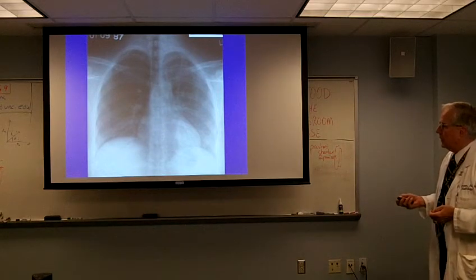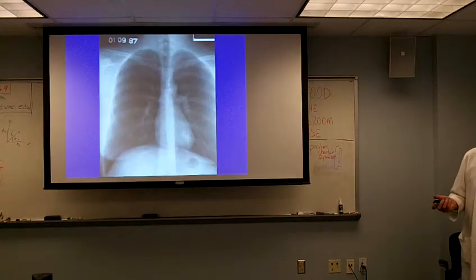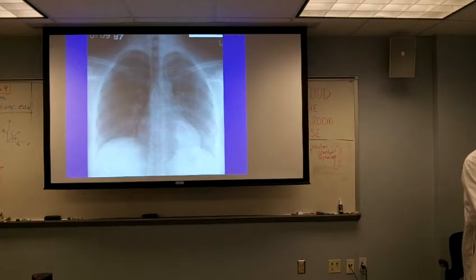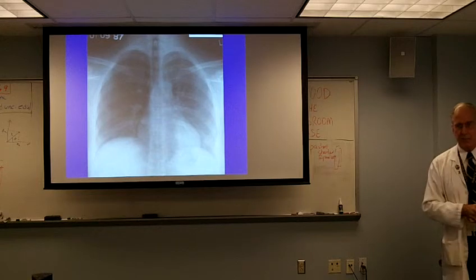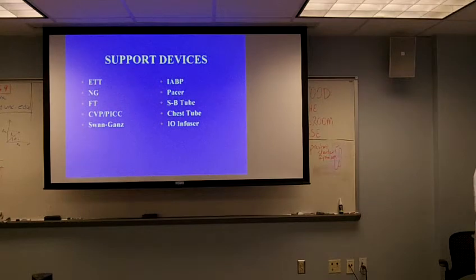Here is a patient; this was an upright film, but it's done in full expiration. Contrast that to this appearance. This is the same patient, two minutes apart, in full inspiration. Look at the difference in the appearance of the heart on the two exams. It looks vastly different. You also notice that down here at the lung bases, the vascular markings are not quite as crisp, and that's what you would expect because the air has been pushed out of the lung bases. So lots of things are going on that affect the appearance of the heart and the chest.